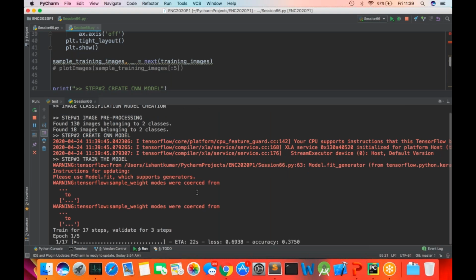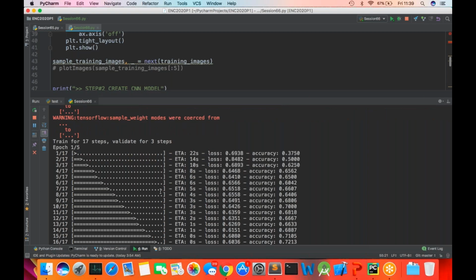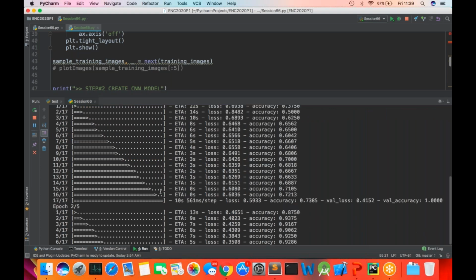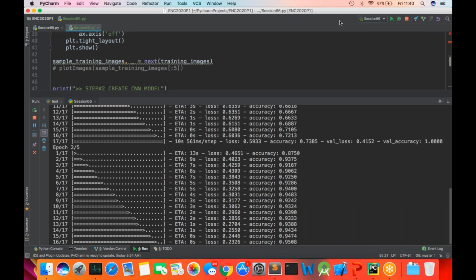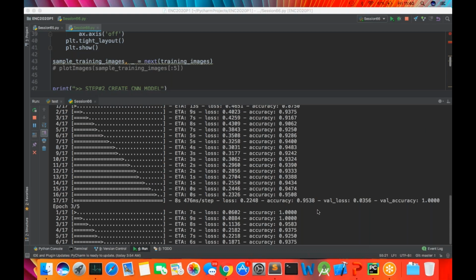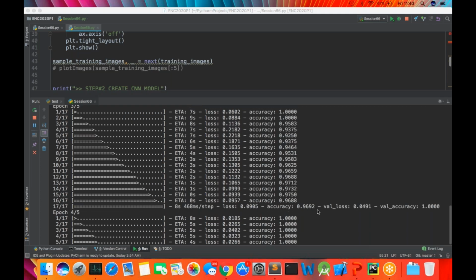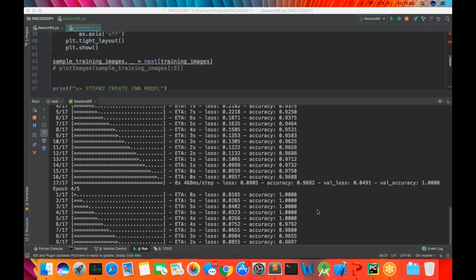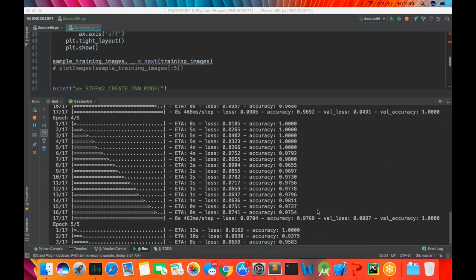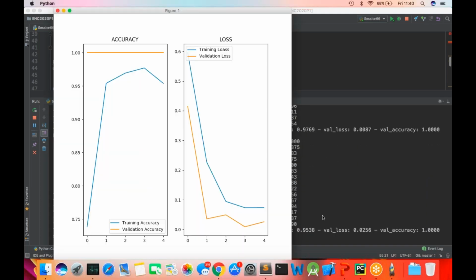So these are just the warnings from the TensorFlow. And of course, yes, in case you are unable to work on your system, guys, you should be working on your Google Colabs. And of course, I have this little number of images, so we cannot rely that okay, the model is gonna work perfectly fine, right? But at the same time, I can see that the loss has significantly decreased and the training part is quite good. So here we are, right?